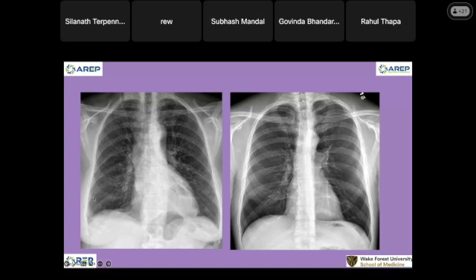I'm not sure that we are on the same page. Okay, let's start from here. I'm going to go here. Keep your eye on this structure. Okay, the right lung is normal. Keep your eyes on it. The left lung is normal. What is this structure?